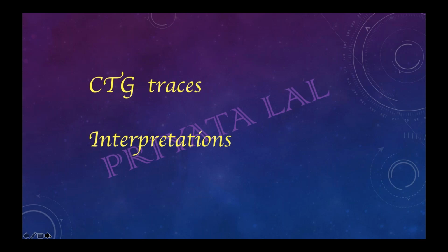The 3 parts are there in each feature. So do all 3 parts need to be there in a feature to declare it non-reassuring, or if even one part is abnormal, we will call it non-reassuring? Even one component non-reassuring makes that feature non-reassuring.